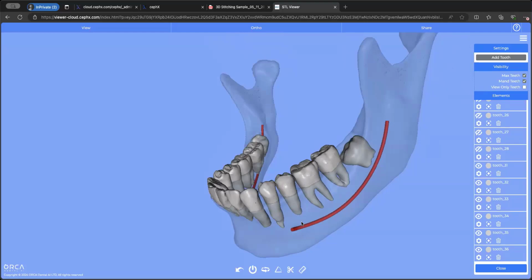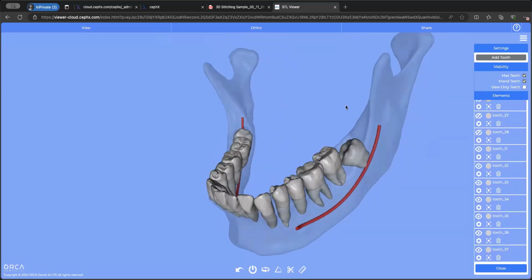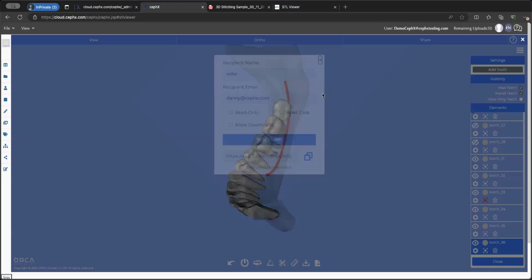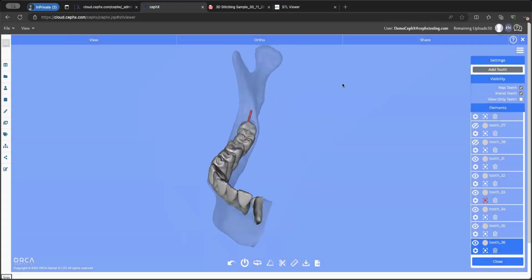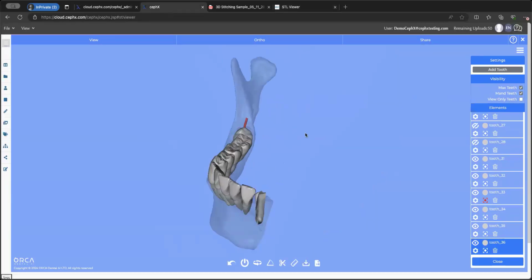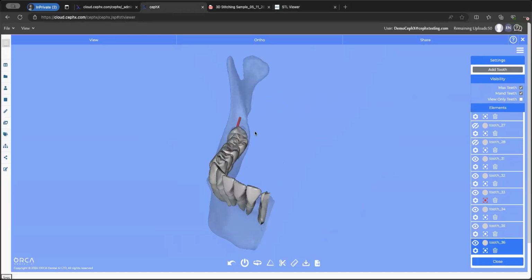Well, not with the cutting, but at least with the angle and which anatomy we're seeing, the same as what we have over here. So again, it's only going to show the mandible with the selected opacity at the specific angle that we have the anatomy here. So that is regarding the 3D.